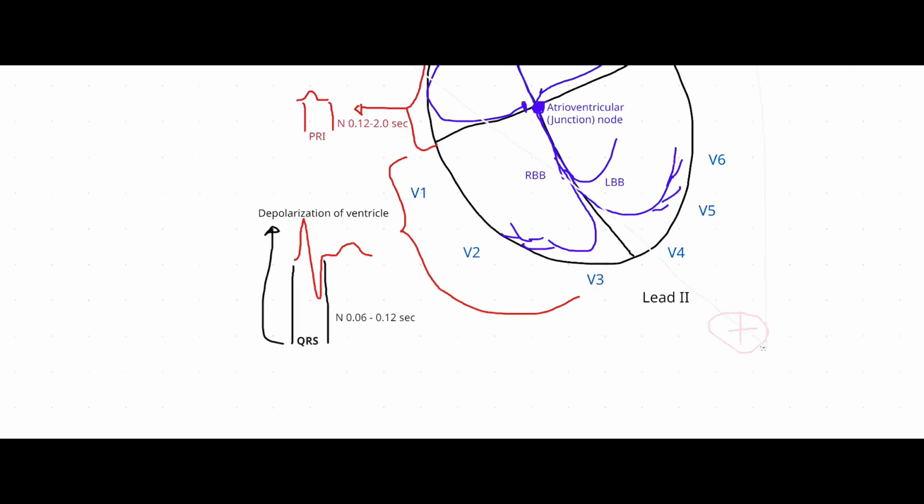Why is the other one so long? Oh, this is the PR interval? Because it's starting from the beginning of the contraction of the atrium to the time it goes to here. This is just the one contraction, and then you measure the other things here.